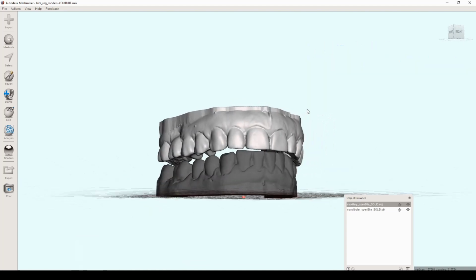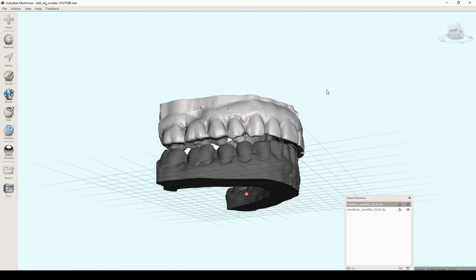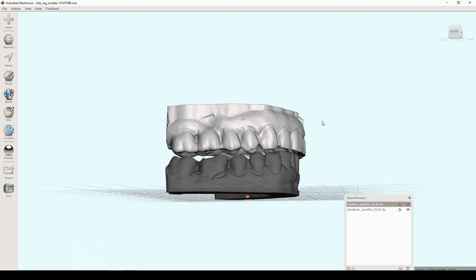As you can see, this is loaded into the CAD software and it looks good now, but once you 3D print them, this alignment's lost. So that's the purpose for exploring these different approaches here.